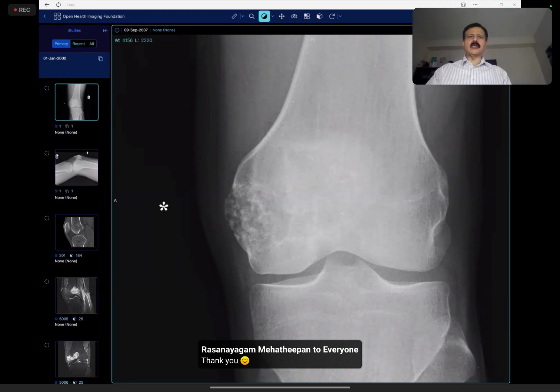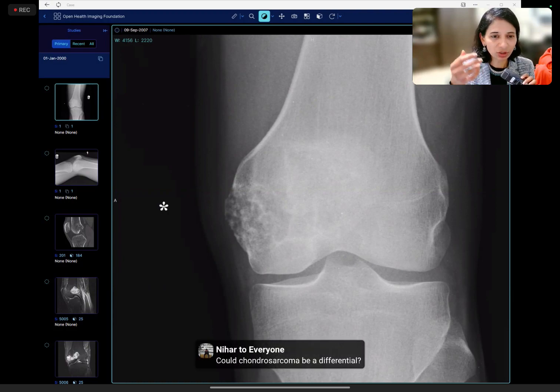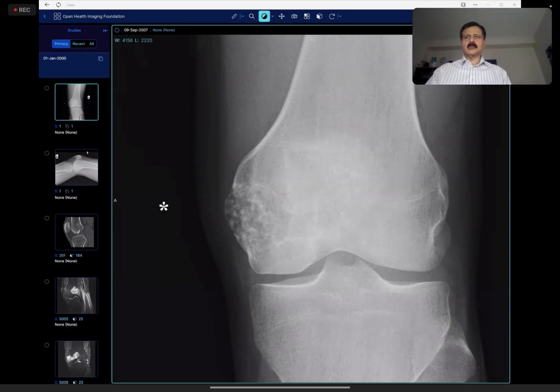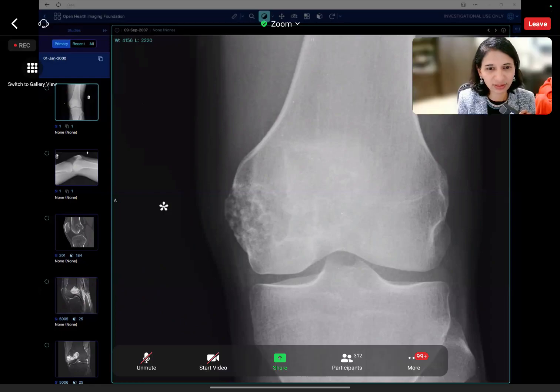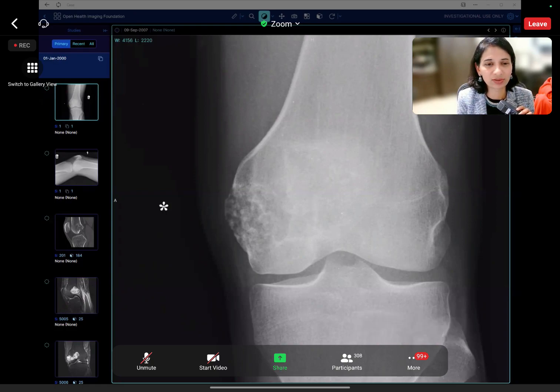That is absolutely fine. And the other question was, there was no calcaneal fracture. No. And remember, in the calcaneum you do have lucent areas that are within normal limits, because you can have fibrofatty changes in the calcaneum. So you can get what you call pseudo lesions in the calcaneum. So there was no calcaneal fracture in that. The main thing in that would be, please look for articulation, and don't miss talonavicular dislocation.